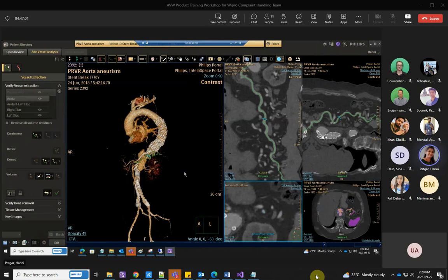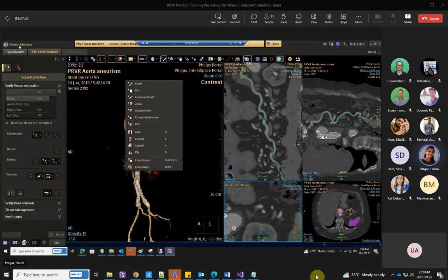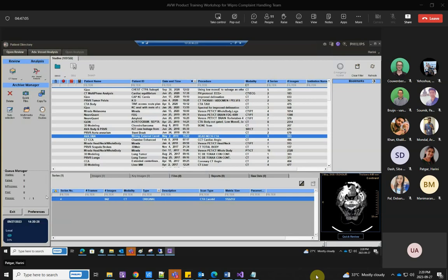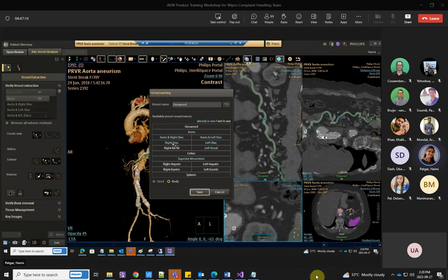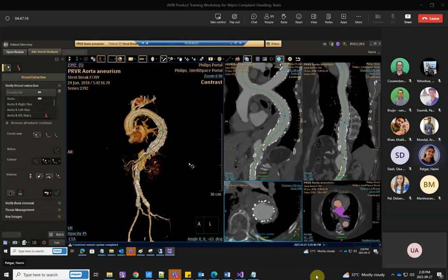Might be the system has got slow because I have also run processing here. No, the process has started for this AVA pre-processing. Pre-processing, in simple terms, segments and keeps the result by itself. So it also happens when you are receiving from PACS, when some study is coming and if we have a rule set, it also does it while importing. Yeah, okay. This is done.